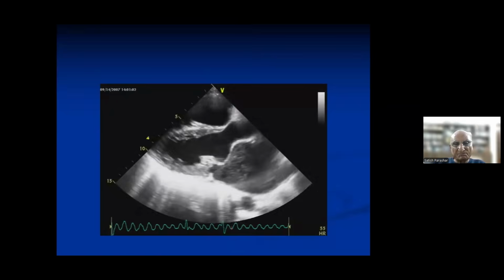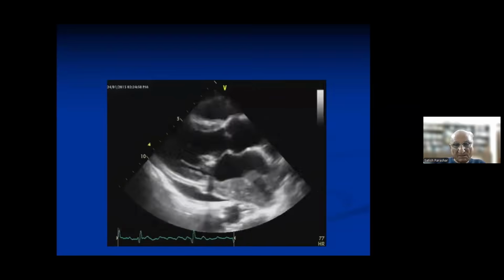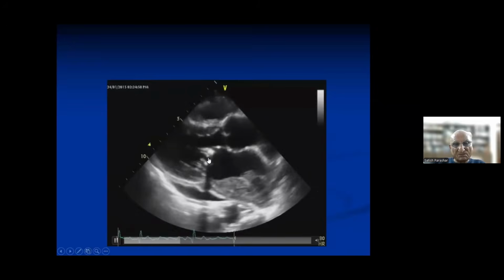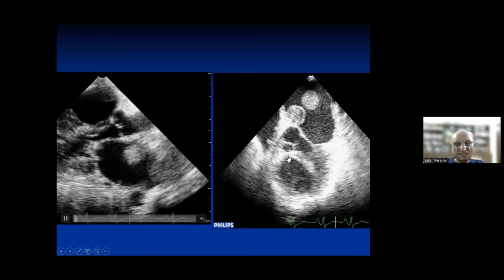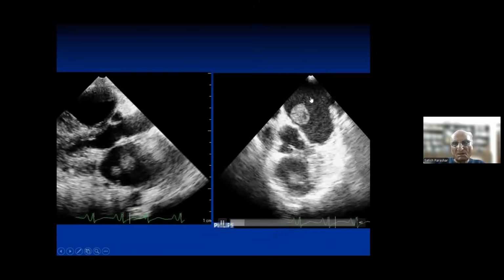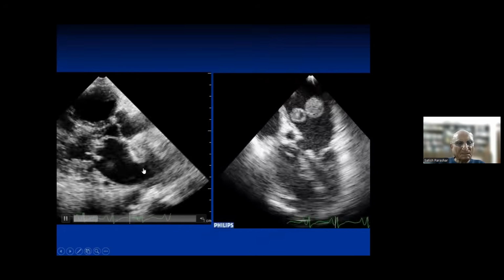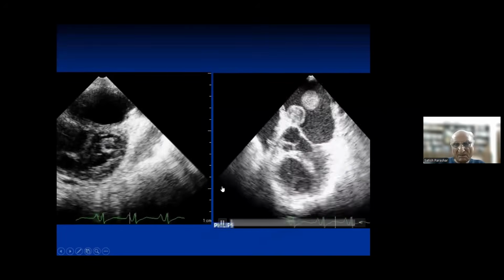And you can see, possibly, I don't know whether you have seen it before or not. So you see this. Then you can see a thrombus with a significant mitral stenosis, a pericardial effusion, and sometimes you can see a sort of moving thrombi, and here you can see a marked spontaneous contrast echo, and you see multiple moving echoes like this.